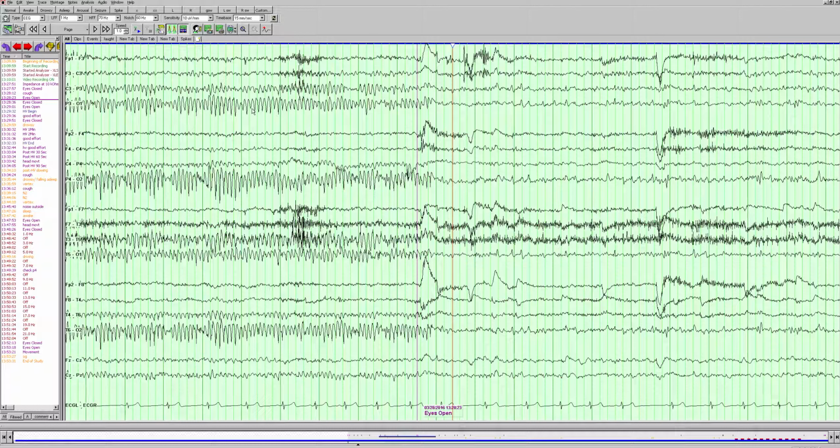That's the frequency. The next thing we want to look at is the amplitude, and to do that, we can actually measure it with this cursor. We can click on the top and the bottom of a typical wave and look over here. That's about 73 microvolts. And in reports, sometimes it's good to give a range. We could say this varies from 20 to 80 microvolts. In some reports, if you have a template, you may not need to say the specifics, but it's always good to know how to measure. So we talked about the frequency, we talked about the amplitude.